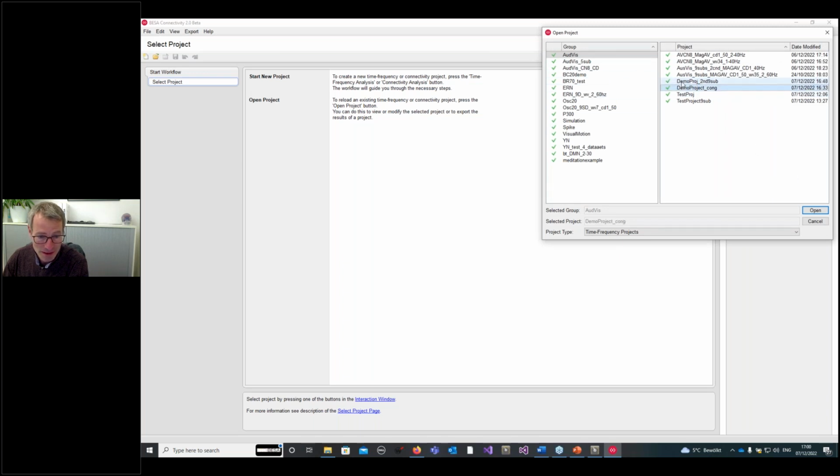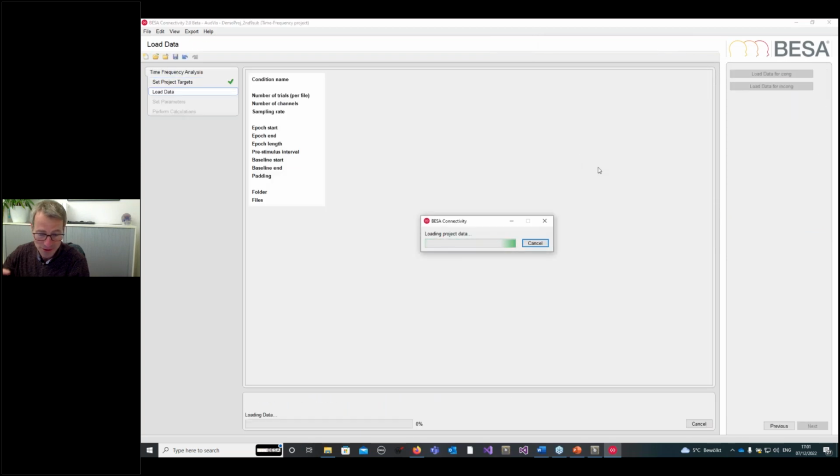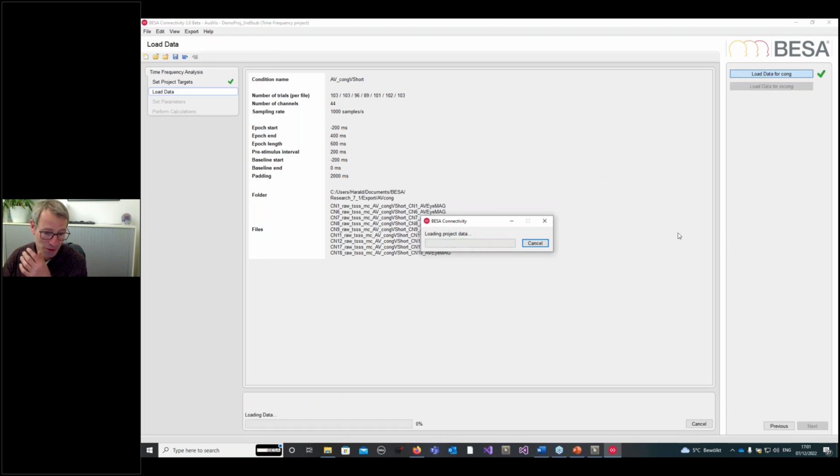So basically what we can then do is open our data set, and then we just go to export. Then it'll batch export all the different subjects into different subfolders, and this will directly be picked up by the statistics. So I think it should be hopefully very convenient to then go to the final step of analysis of your group experiment.